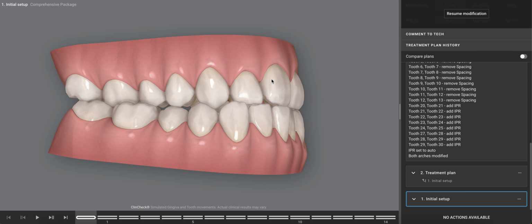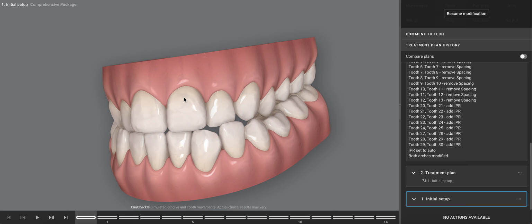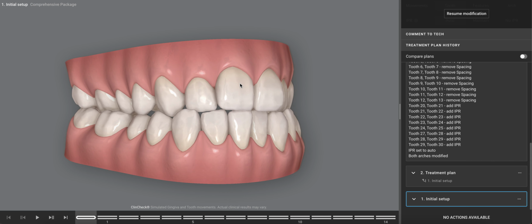If we're not going to get there, what is the trade-off with the aesthetics? So in a nutshell, as I'm thinking about what to do here, there's a lot of diagnostic underpinnings that we have to think about. So before I talk about what we're going to do, let's review. IPR in a class 3 situation, I'm more likely to do, especially if there's low airway risk.